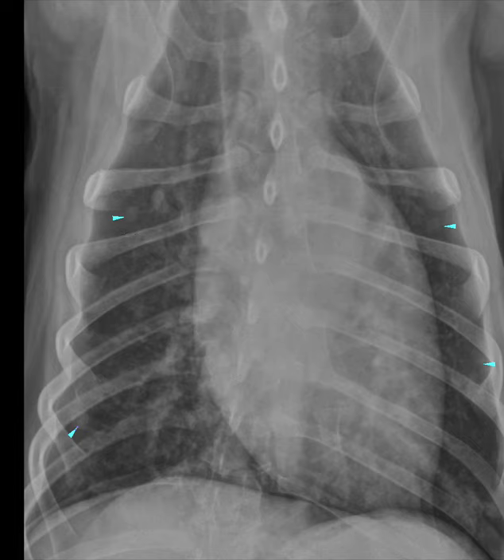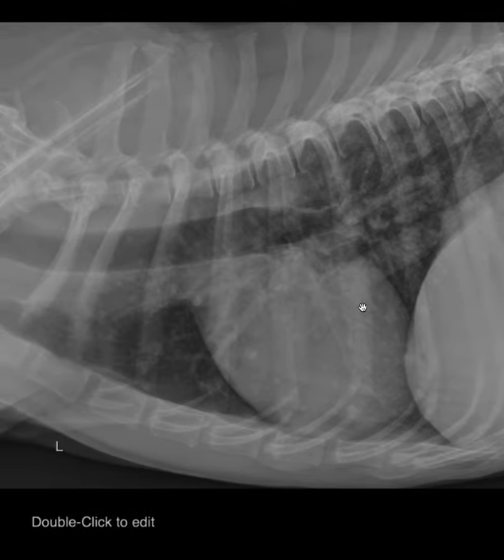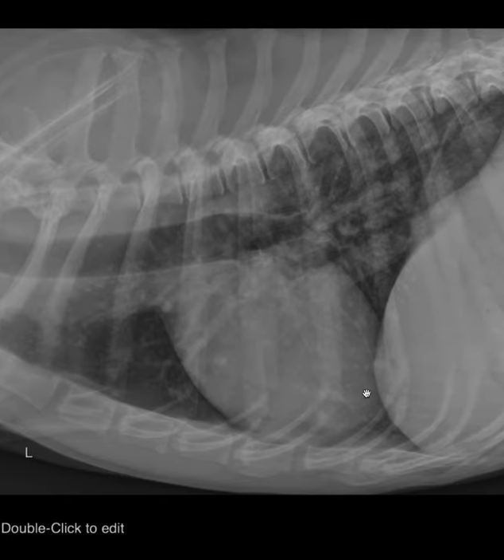So what I mentioned last week is that I comb all the lungs on all the views, and in doing that in this case, my suspicion or my findings are only further confirmed. Everywhere I look, all views, all lung fields, I'm finding nodules. So here's a case where we can clearly conclude nodules, but what else do we want to pay attention to on this radiograph?